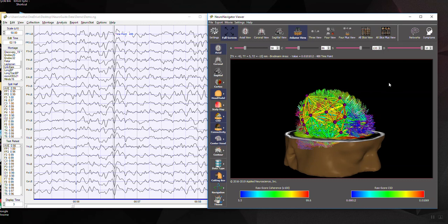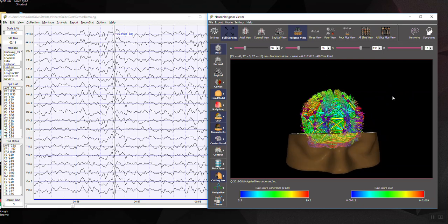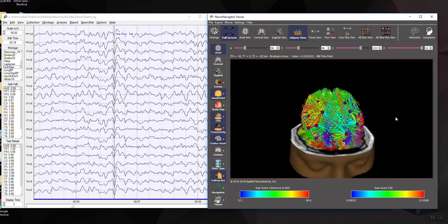For example, the longitudinal fasciculus in the left hemisphere would be the frontal occipital longitudinal fasciculus. So you would see the voxels that represent the frontal part of the frontal occipital fasciculus and the coherence between those voxels and the voxels in the occipital lobes, representing where the termination point is of the frontal occipital fasciculus. And that's true of all of the various diffusion tensor imaging networks.